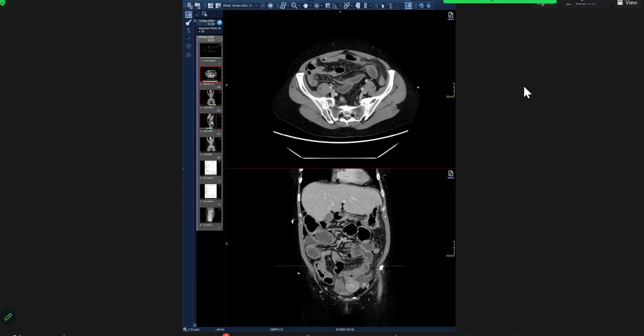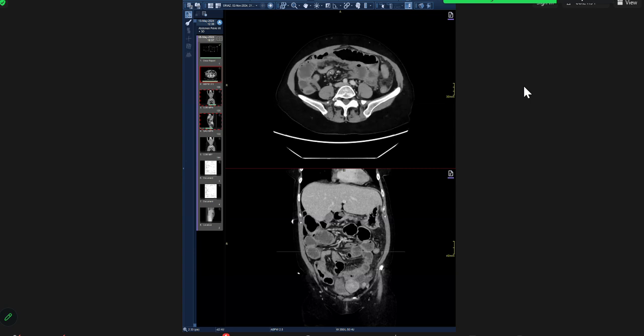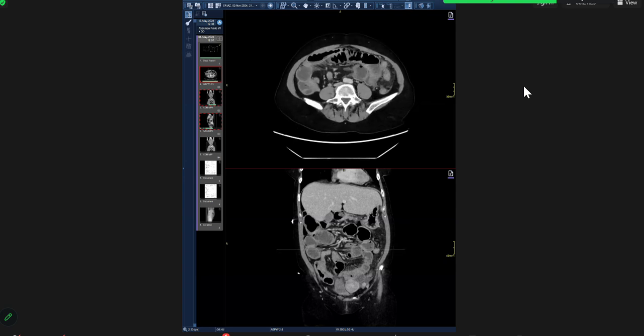In this case, there is no transition point. I'm going to go through this with you. So you see the dilated bowel is coming, and then it just comes like this. It is coming because it's not obstructed. There's no obstruction here. Yes, ma'am.